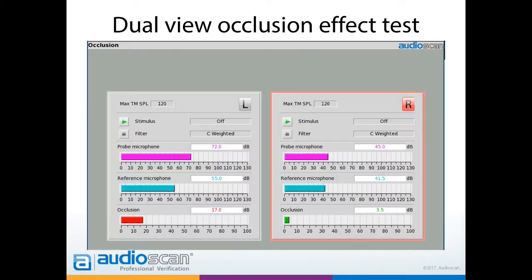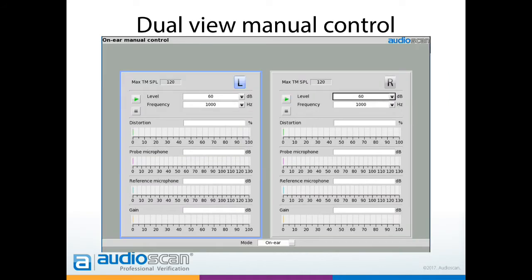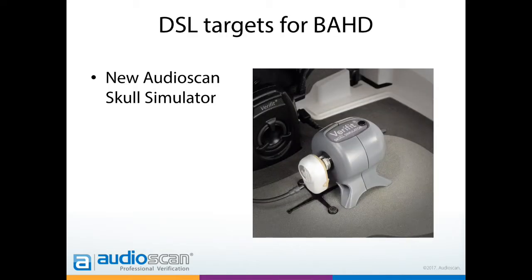The occlusion effects test is now dual view, both ears on screen at once, and the manual control screen is also now dual view, just for convenience. In 2017, Audioscan announced the upcoming release of the new Verifit Skull Simulator. Now, the Skull Simulator isn't ready to ship yet. However, with this software release, we have added the targets for all the compatible products.